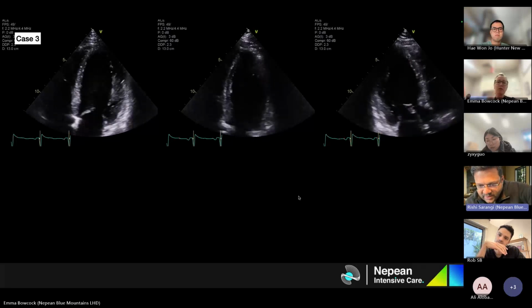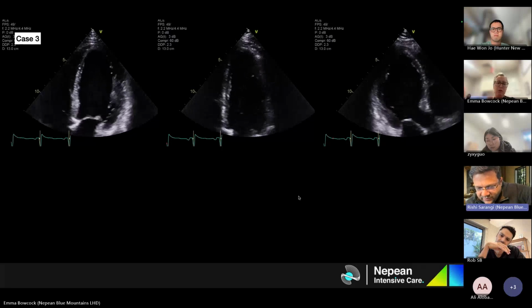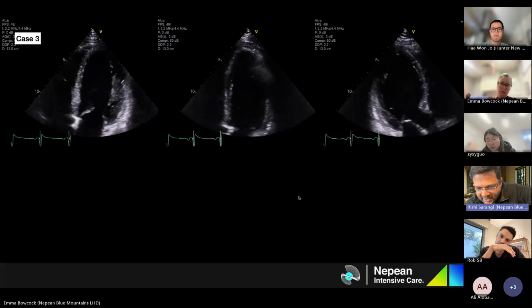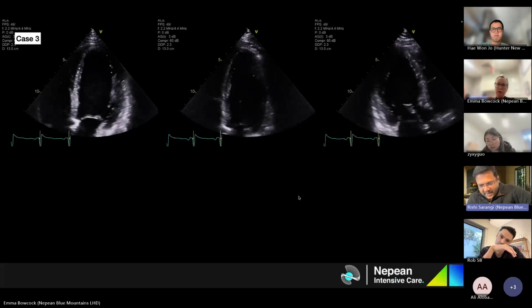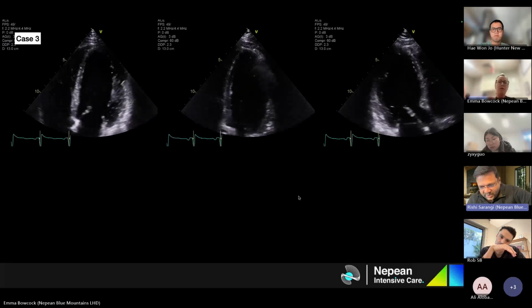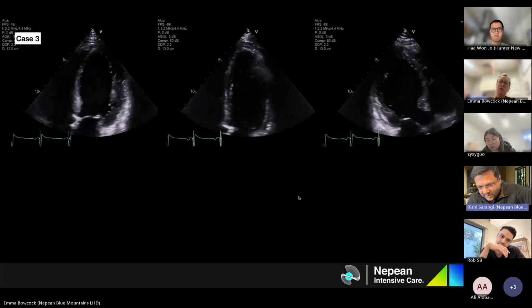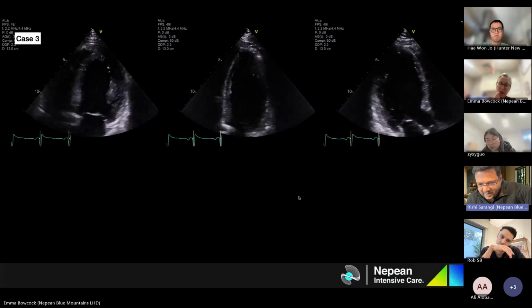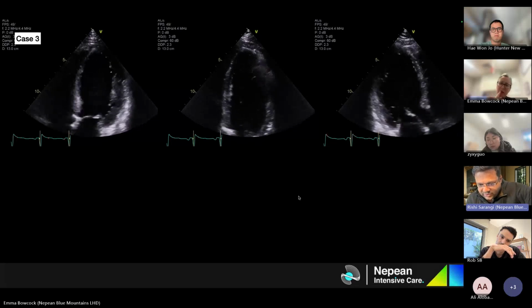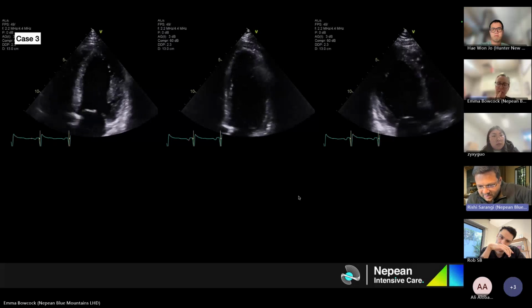Commenting on the 4-chamber views, these are focused views looking at LV function and thickening of the walls. The anterolateral wall appears to be edematous or thickened subjectively compared to the inferoseptal walls. Inferoseptal wall appears to be thinned. There appears to be reduced thickening or contractility at the base compared to the apex.